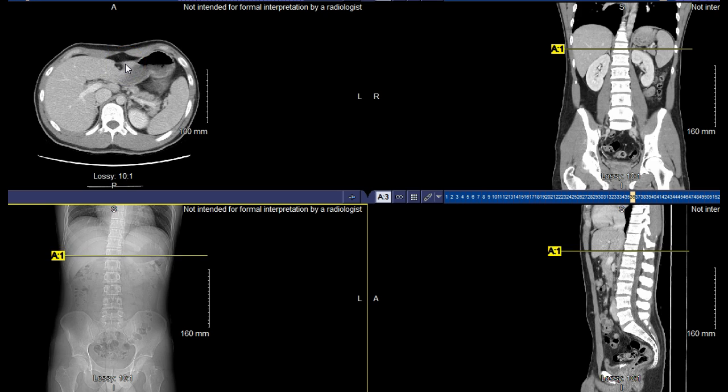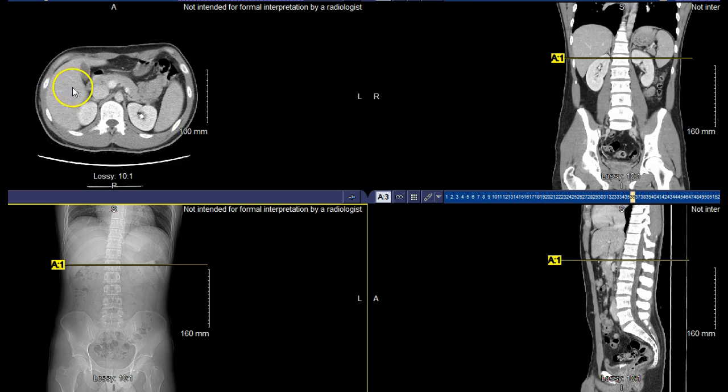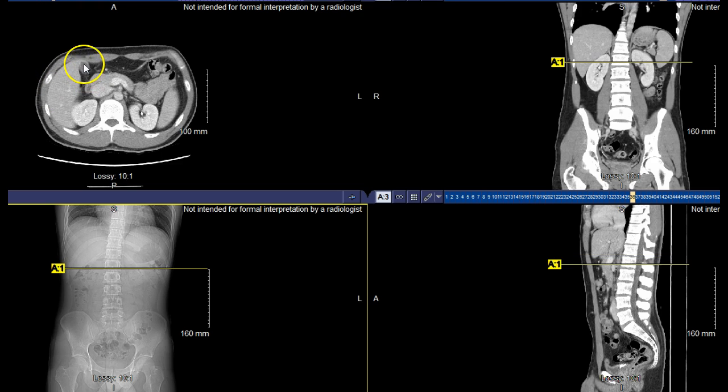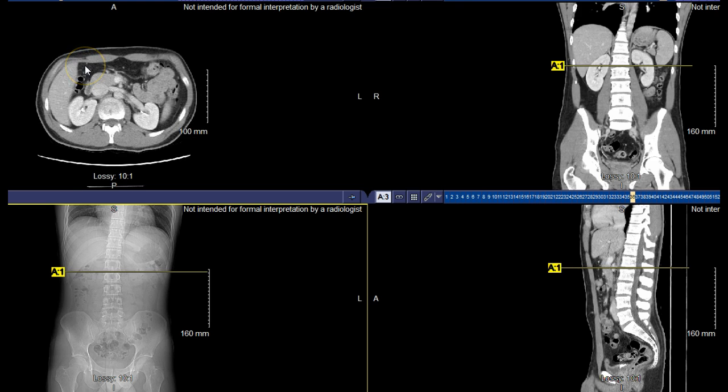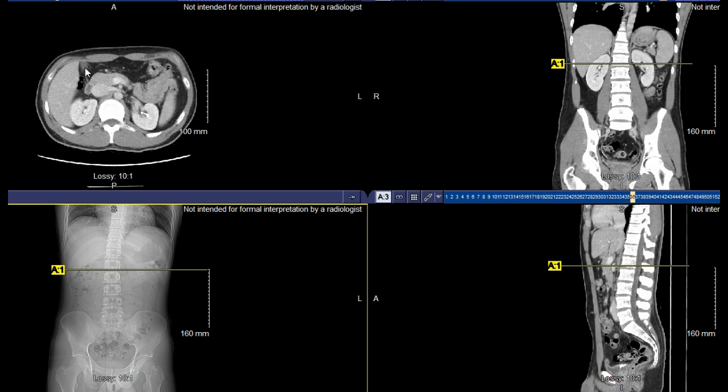see it. Other areas to note, focusing still on the liver, you can see that posterior structure of the gallbladder formed right there. So you can see that and follow that down as well. This gallbladder isn't huge by all means. It's only available on a few of the slices, but nonetheless, you can see where it's at. And like I said, utilize the localizers to keep that frame of reference so you see where it's at as well.